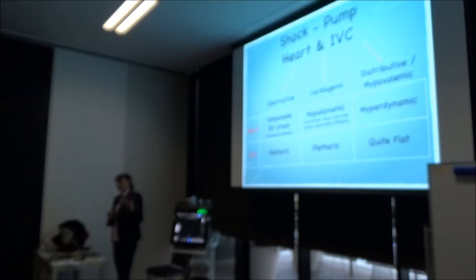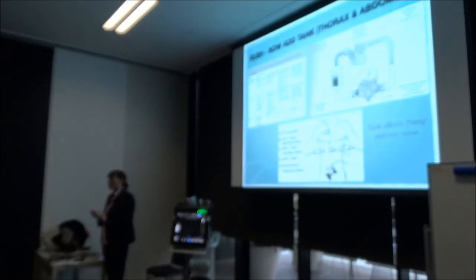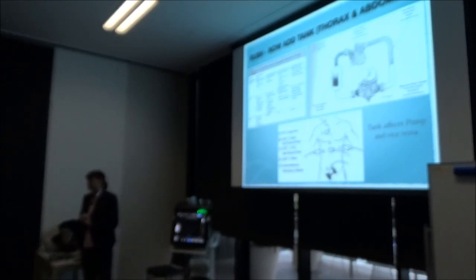So I spent the most time on the heart. We're just going to quickly run through the rest of them. We're going to move to the tank. And the tank is any reservoir that can carry fluid. Essentially, your EFAST exam. Okay. You guys all comfortable with the EFAST exam?